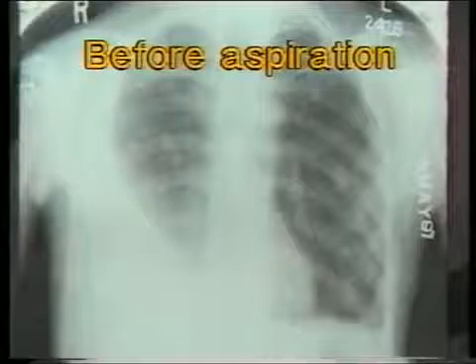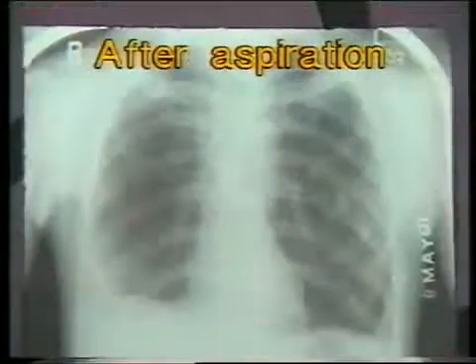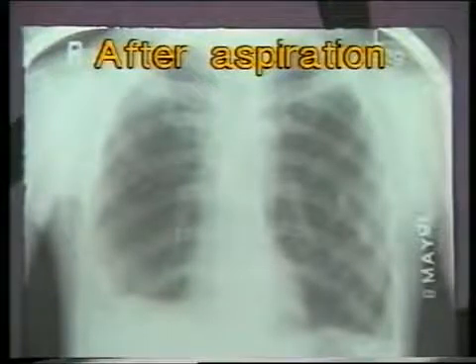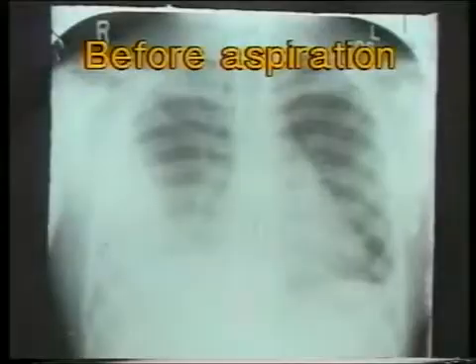Now this is a set of two X-rays of a patient of right pleural effusion before and after aspiration. This is a very typical shadow of pleural effusion. And this second X-ray after aspiration shows that the fluid is removed, the lung has expanded, the costophrenic angle is clear, and there is a diffuse thin haziness in the right lower zone, which is due to the pleural reaction or inflammation.